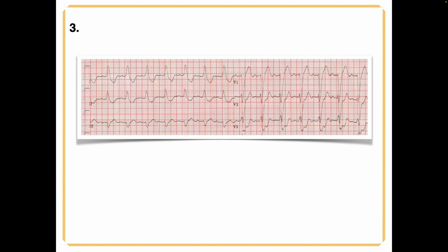Correct. And then I'm going to look at Sgarbossa A, so that would be lead 1, 2, aVR, aVL.